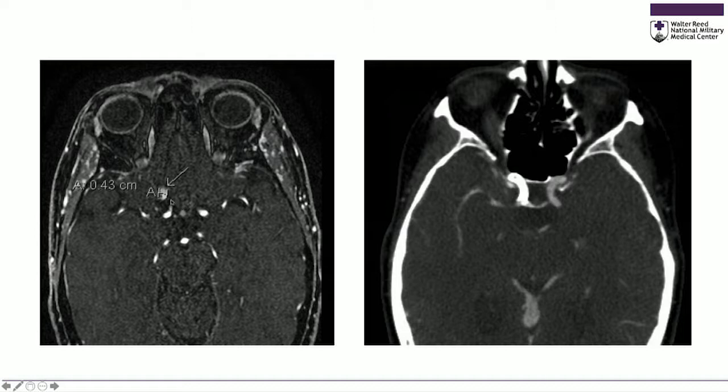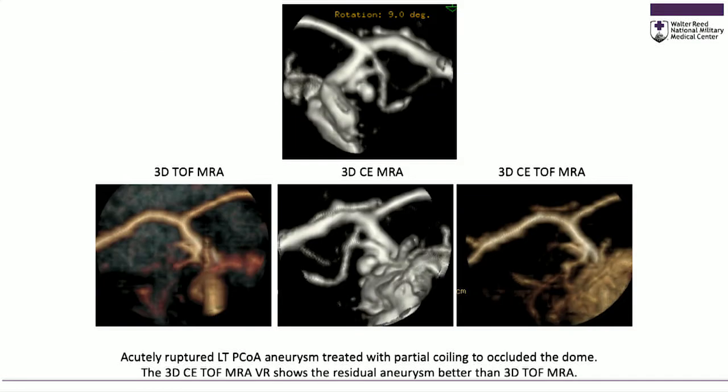and we could tell that it was smaller than it was immediately post-angiography. Then the surgeon decided to go with CT the following time because he was a little bit worried for some other reasons that there might be some stenosis developing within the stent, and that's very good right now with CT. And you can see the sac has almost completely gotten smaller. So there are multiple ways that we can follow up patients after they've been treated, and we target and tailor the study to answer the clinical question.